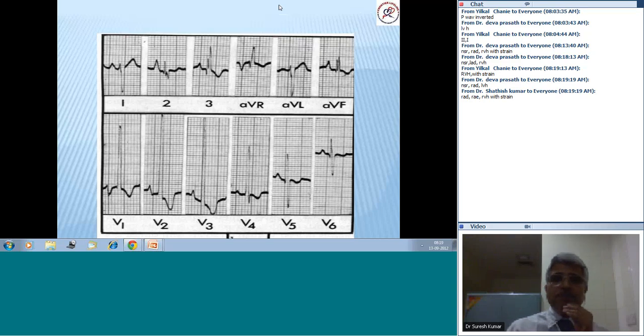There is a right atrial enlargement. Look at the P in lead 2, and you do find RVH with strain. So this is quite compatible with say valvar PS or severe PAH. Somewhere you should also note, look at this P in V1. This might denote an associated left atrial enlargement, but if there is a huge right atrial enlargement, the negativity in P in V1 may be related to that alone. So interpreting it as a left atrial enlargement may not be specific. Good.